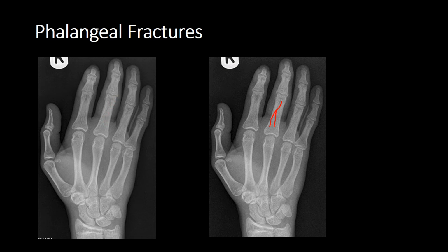Now, although you have two fracture lines, please don't call this a comminuted fracture. The reason being is that if you say comminuted, that implies multiple quite large fragments, and the orthopaedic surgeon would then be thinking that they would need to actually line these separate fragments together and hold them in place.